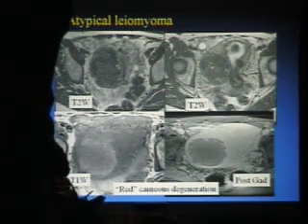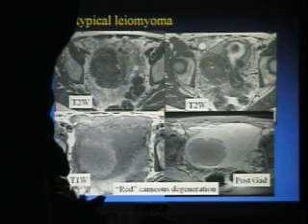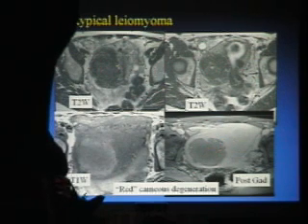Well, this is the classic appearance of what's known as the red or carneous one. This is red or bloody hemorrhagic fluid on a T1 weighted image. And it's necrotic already, it's degenerated, because after we give the gadolinium, we can see that this is not enhancing. So again, another case that would not respond to uterine artery embolization or focused ultrasound.